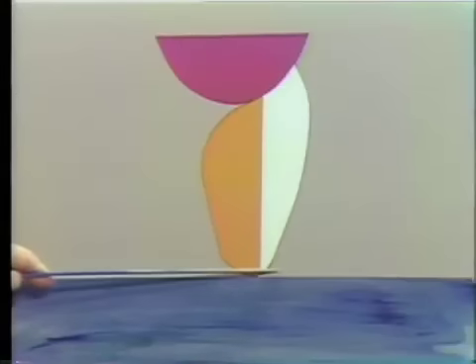The other is that the porcelain facing here should be streamlined and contoured in this direction to avoid a flat biting edge on it in this situation. And those two are blended together in this way, resulting in the gold being rounded, being just a little more prominent than the porcelain, so that if the patient bites onto any hard object, the first thing which it hits is the gold backing, and the porcelain is protected in that way.